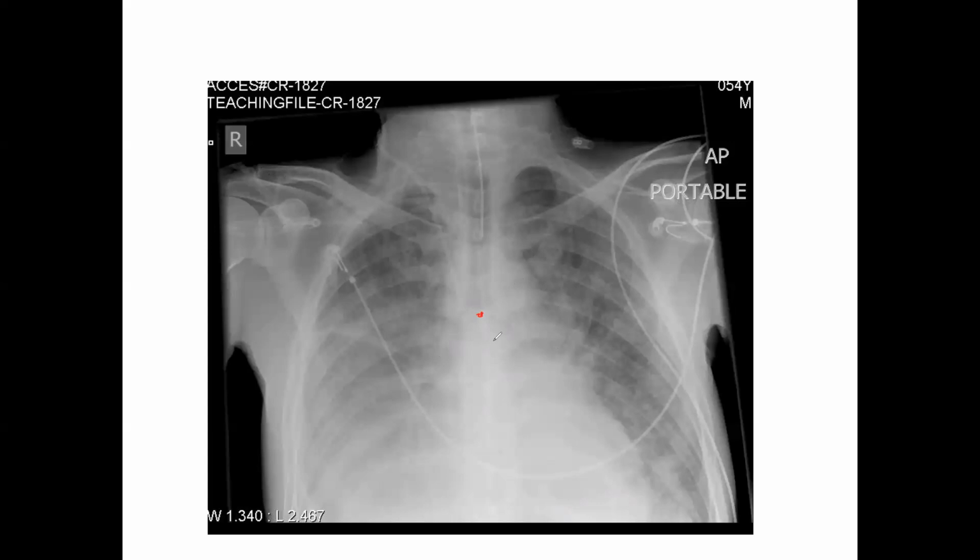Another item in this particular chest x-ray that we've not seen just yet, you've got these electrodes that are on your patient, and then you've got the lead wires. You remember going over ECGs. These are going to be the items which create the leads, or part of the electrodes that would look into creating your standard limb leads 1, 2, and 3 as we work through there.